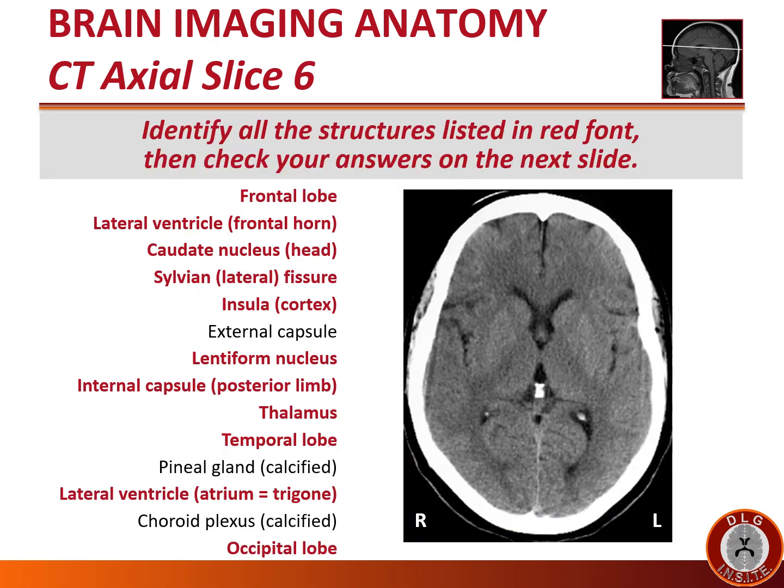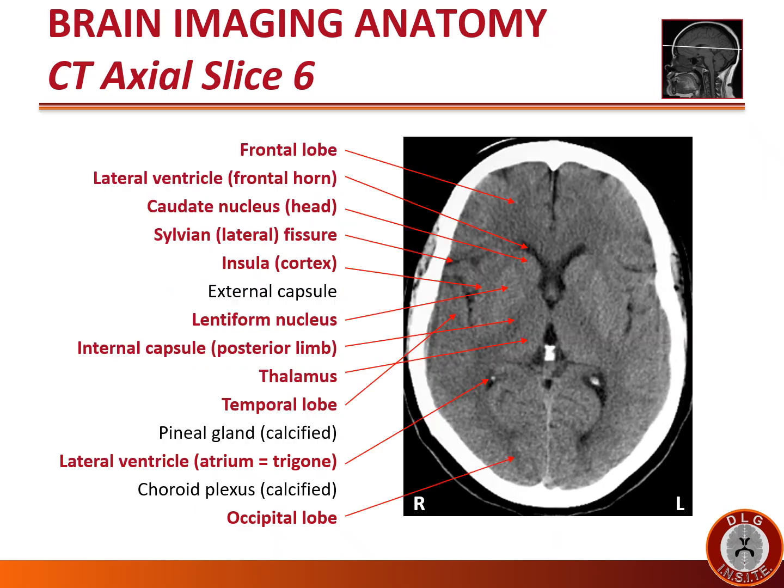Please pause for a moment on this slide to identify all the structures listed in red font, and then check your answers on the next slide. Please spend some time on this slide carefully reviewing the correct locations of the structures listed in red font.